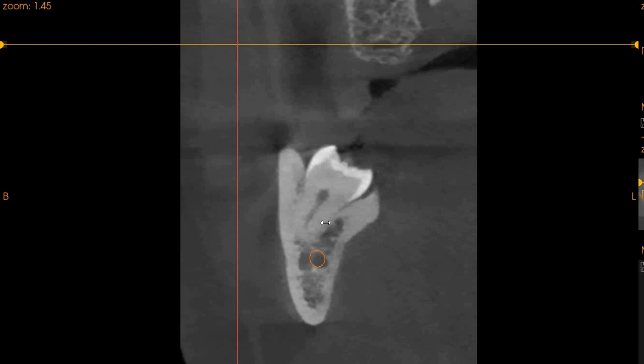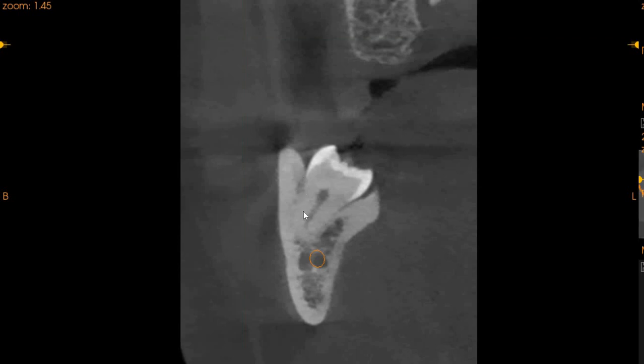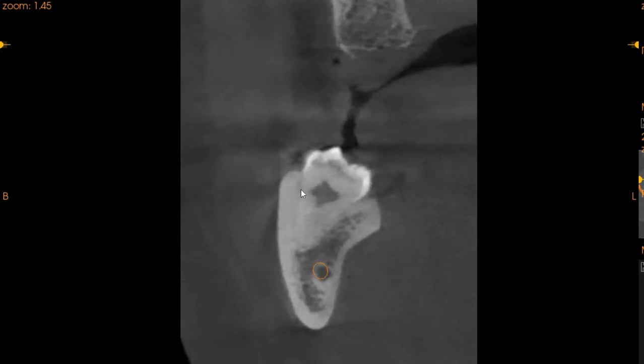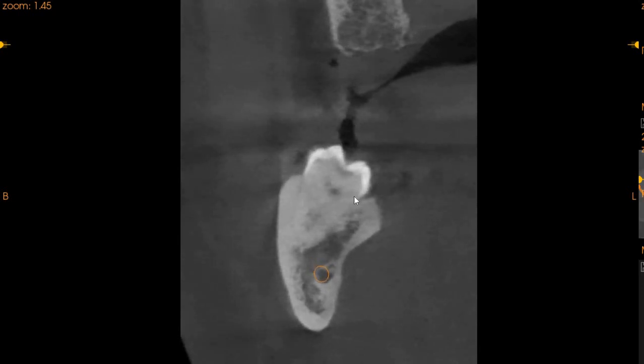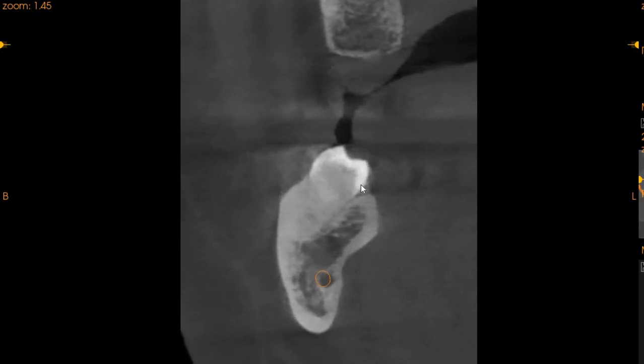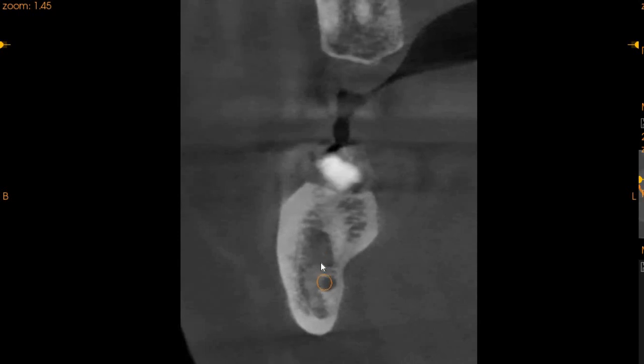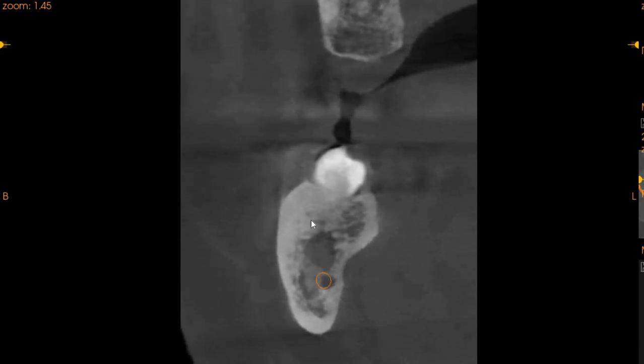On the lingual cortical plate there is very nice periodontal space, but on the buccal aspect the periodontal space is absolutely negligible. It is very closely fused with the tooth, and extracting this tooth is going to be a significant challenge. There doesn't seem to be a radiolucency associated, but we do see an area where the trabecular bone shows a radiolucent area, but we don't see any major radiolucencies associated with the tooth.